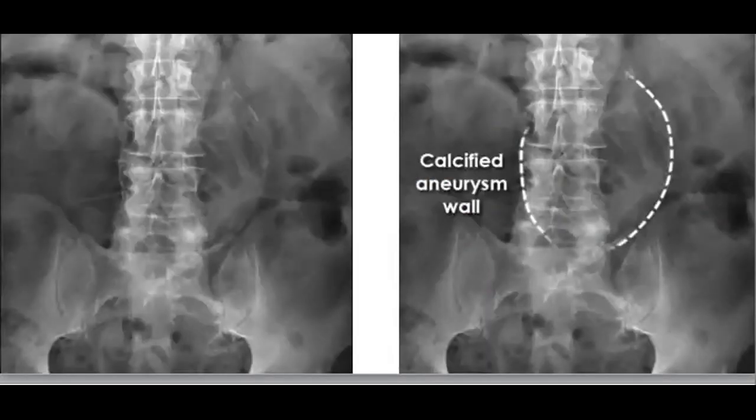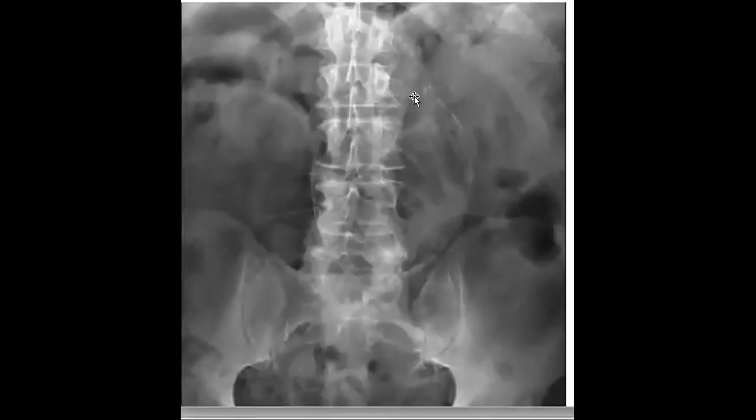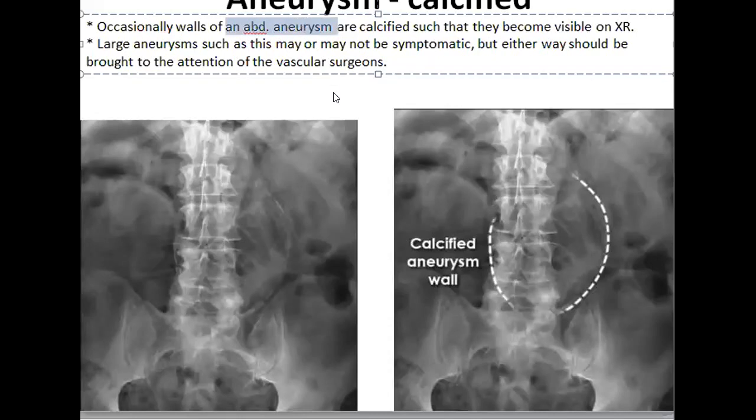And here, before I show you the answer, if you find any vascular calcification with curvilinear appearance, yes, aneurysm until proved otherwise. So don't forget this curvilinear outline. Aneurysmal aortic dilatation, because it's critical. Very important to check if there is any calcified aneurysmal wall. So aneurysmal wall calcification in the abdomen, aneurysm is one of the important checklist items in the exam.